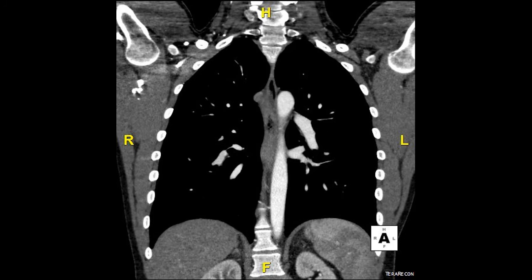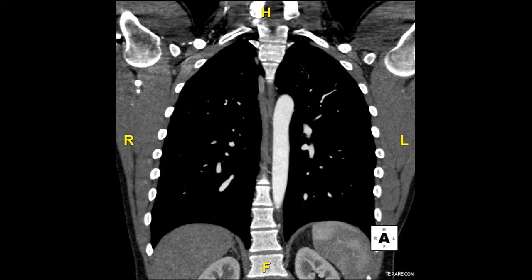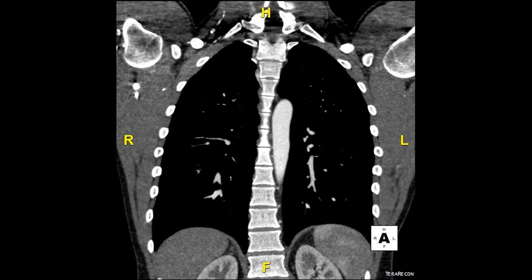The trachea and primary bronchi have disappeared, but a new structure has come into view that we will continue to see in the next few slides. I'll just quickly circle that in blue right now. The structure we just circled is the descending aorta. The descending aorta starts to disappear now as we see more of the thoracic vertebra come into view.